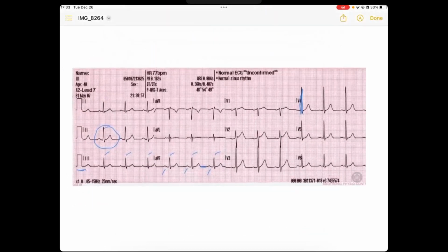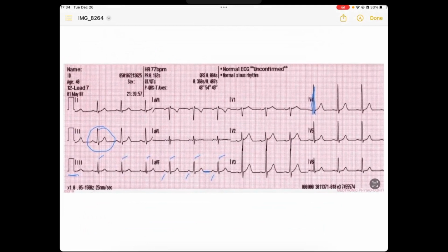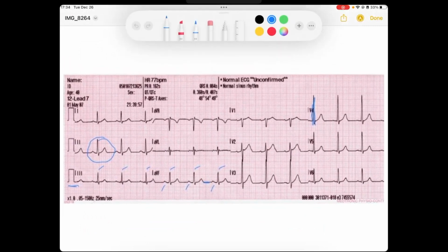And so as I look here, P waves are generated by our sinus node. And we know that the sinus node beats at a predictable rate. And so I would come here and maybe look at the rate. I would mark a solid line and 300, 150, 100, 75. That's maybe 75 beats per minute. Okay, that's a good sign, right? And so when I look at my P waves, I'm saying, is the P wave driving this 75 beats per minute? And I look here, I see a nice P wave, P wave. I don't see any P waves in between.